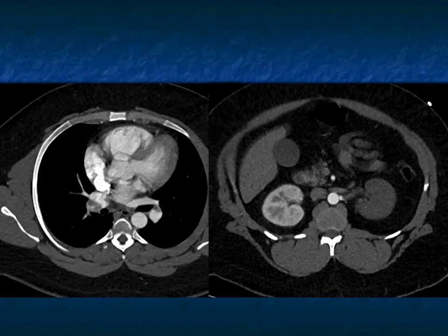When I look at the limited exam of the patient's chest, I see multiple pulmonary emboli. Now you ask the question, pulmonary emboli and aortic thrombus, that is in the renal artery, so you have stuff on the arterial side and the venous side. What is showering, or how is it that you can have the connection? And there's been a number of articles about this, and this is classic. Think about it. Think about it hard.